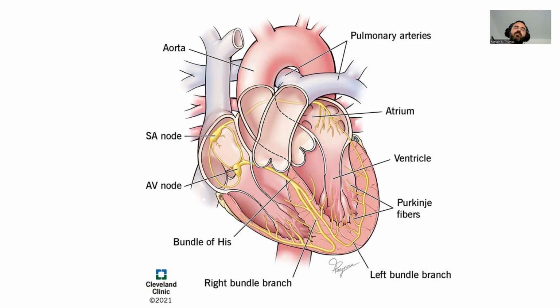That's useful. I'm not saying don't learn that stuff, but being able to just look at a strip and understand what's happening in the heart is going to be way more useful to you than just memorizing things, right? Because you can always ask a colleague or Google search something like, hey, how long should a P wave be? And you should probably know that, hopefully. But worst case scenario, if you didn't, you can look at a strip and say, hey, something's off about this. Just looking at this, I can tell that there's too many P waves, or the P wave looks too long, or it's just malformed.